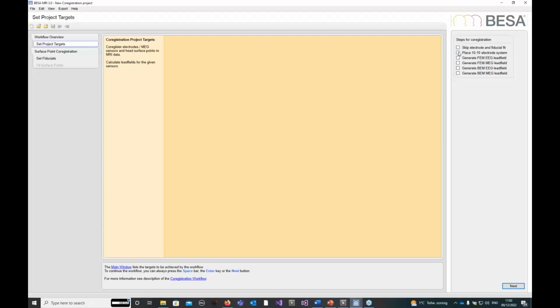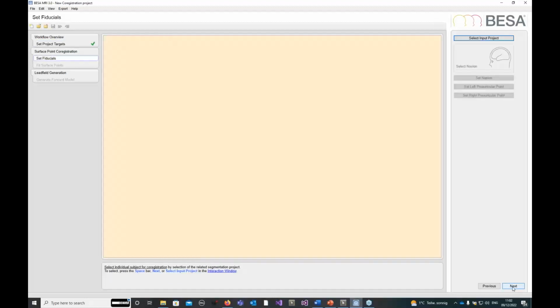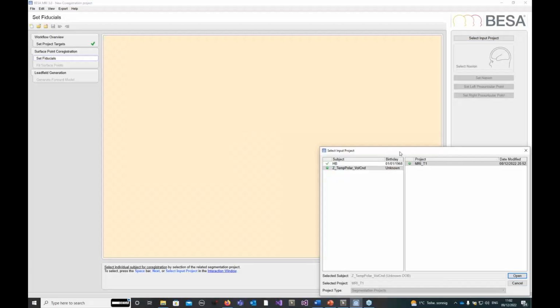So one thing I can maybe show you at the end of this webinar as well is I can also place electrode system if I don't have digitized information. And then, of course, I can tell the program to generate lead fields, so finite element and boundary element lead fields for the EEG analysis. Same is possible for MEG if I have MEG data. So I go next and then next again to select my input project. So this is the MRI that I've just segmented.